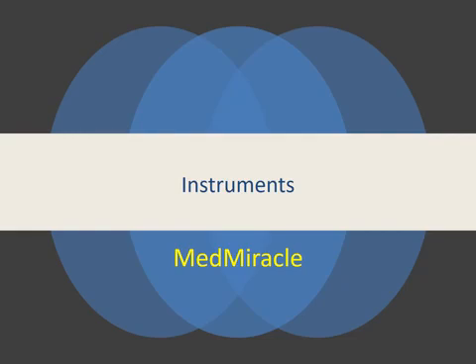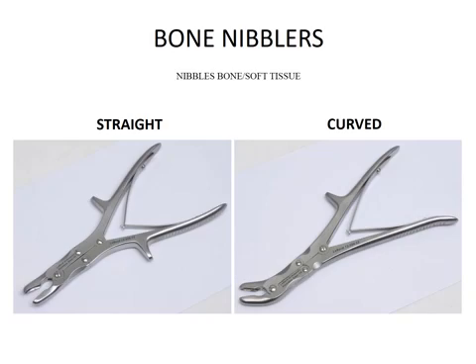Hello. So we start about instruments now. Orthopedic instruments and orthopedic implants are expected MCQs. In May 2017, they started this trend and it is expected to go on. Let's start with the general instruments.